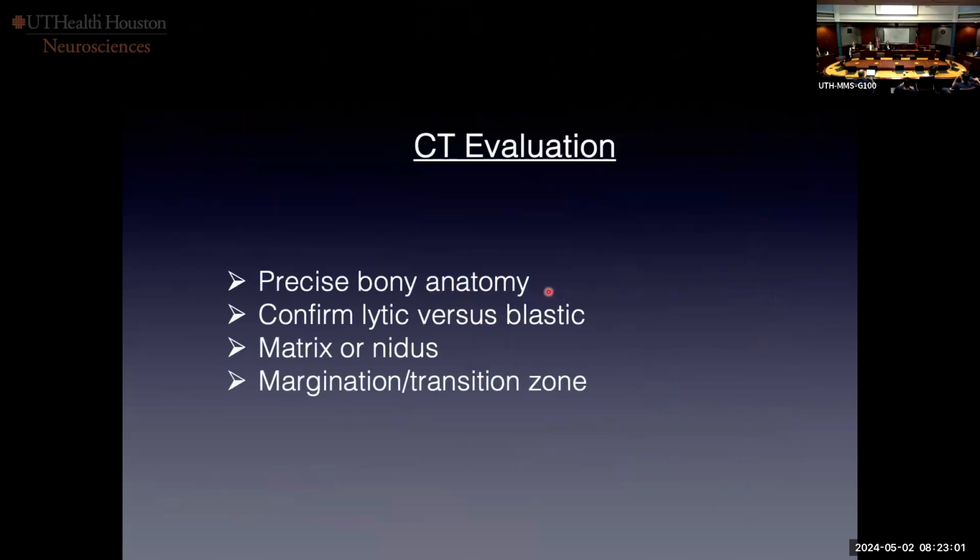Because Dr. Stark and Schmidt don't want to just hear it's posterior elements. They want to know exactly how much of the pedicle is involved. You know, what's the relationship to the facet joint? What all do I have to take out?